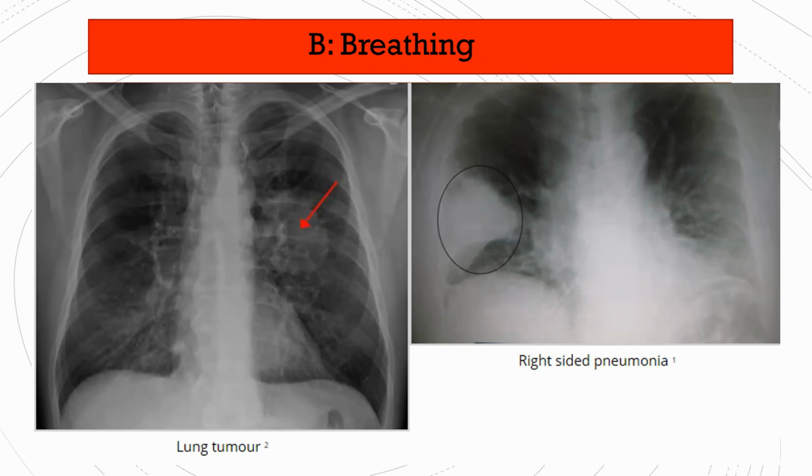And this is also called increased shadowing, but it's indicative of a pneumonia. You see how it's not at all the same as a tumor that is round. It looks like the whole triangle is filled with whiteness. So again, you can't tell which lobe it is, but here I can see increased shadowing in the middle and lower zone of the lung, okay? Don't talk about lobes.